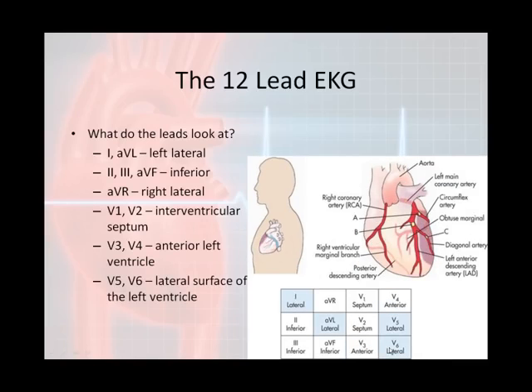And of course, V5 and V6 are your other lateral leads, way over here, looking way over here on the left lateral.